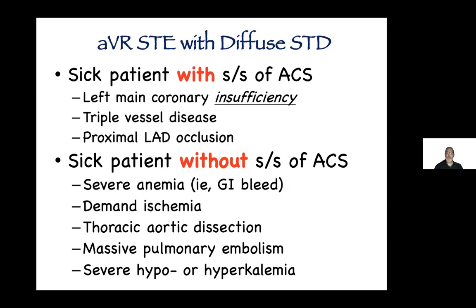Last pattern here, this pattern of ST elevation in lead aVR and diffuse ST segment depression. So aVR is often referred to as the Rodney Dangerfield lead. It doesn't get any respect because we used to completely blow that lead off, totally. There's diagnostic value in lead aVR. So when you see ST elevation in lead aVR and multiple leads with ST depression, then you're looking at something. It's often difficult to put your finger on it.